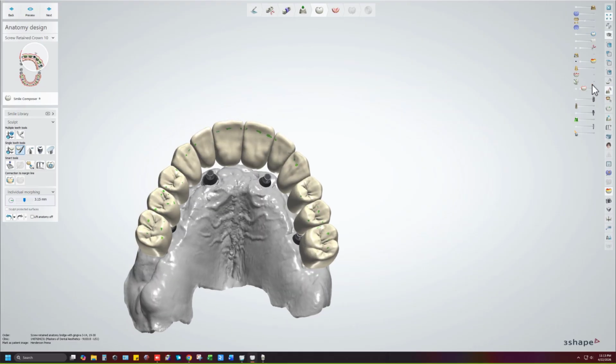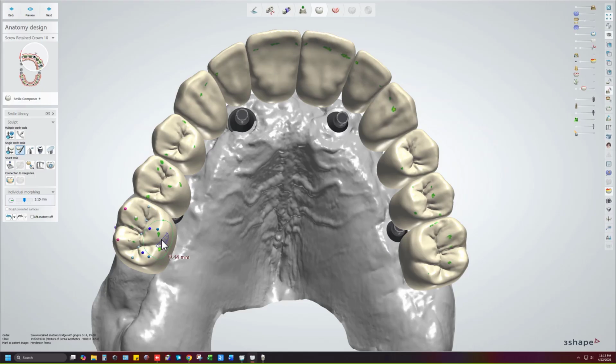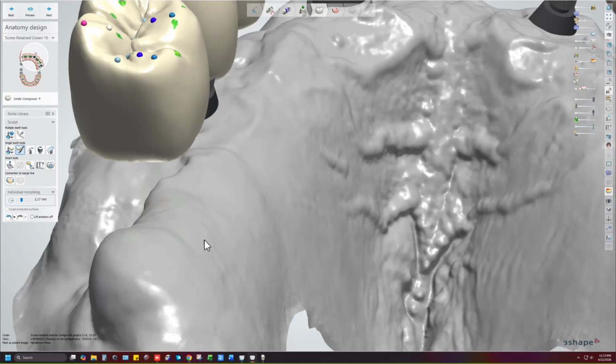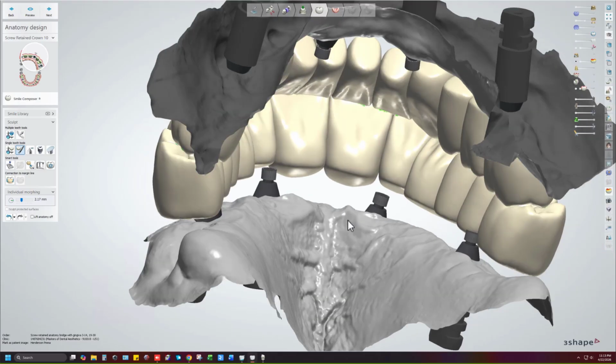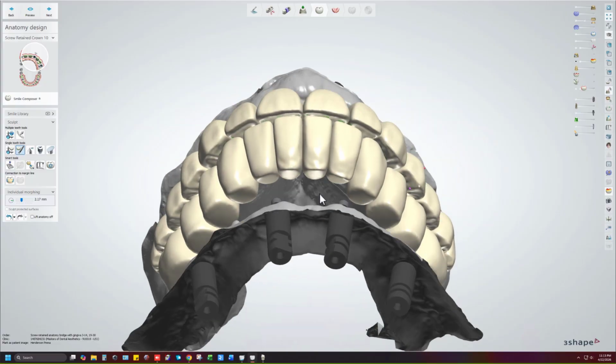So I set it to 0.21 or 0.25 out of occlusion. And there's just some spots right here, 0.25, 0.26. Now, maybe a little bit here. Could I nitpick and bring all of this in? Yeah, but for the temps, we just needed to get them to where it needed to be.